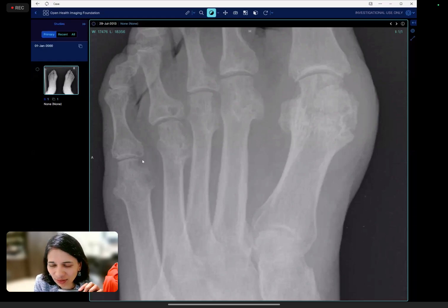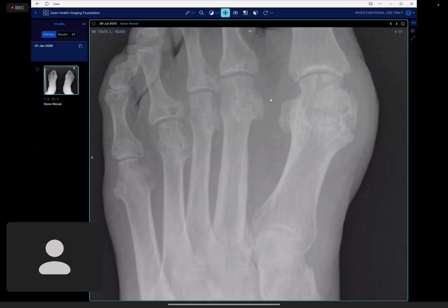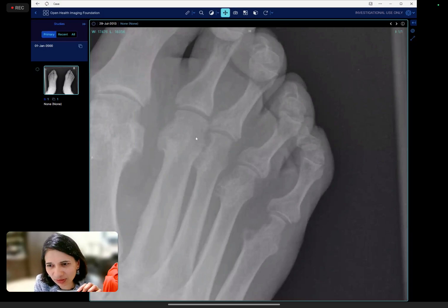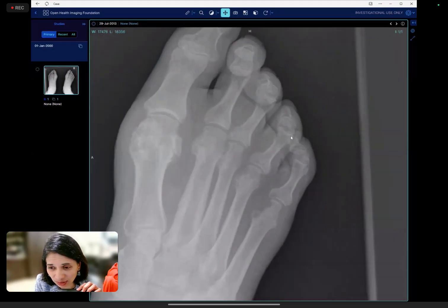But if you look at all of these, they are all periarticular, close to the articular surface. Look at that one. And you'll have to think about it, it's very symmetrical. It's the MTP joints bilaterally, equal to the MCP joints in the hand, and look at that. So a lot of it is periarticular rather than juxta-articular.